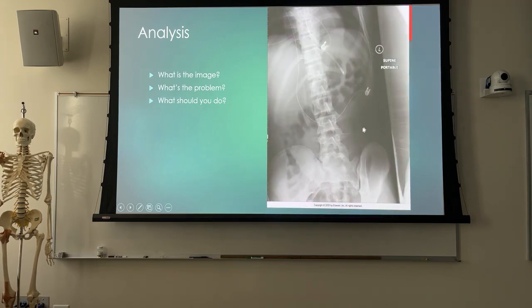All right, so this is a train wreck, really. We've got a lot of stuff wrong on this one. We've got rotation, serious rotation. We've got tilt. Part of this is just completely flipped. But can they see what they're looking for? Bingo, bingo. So what do you see here?